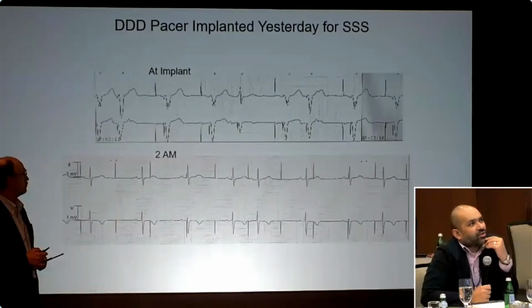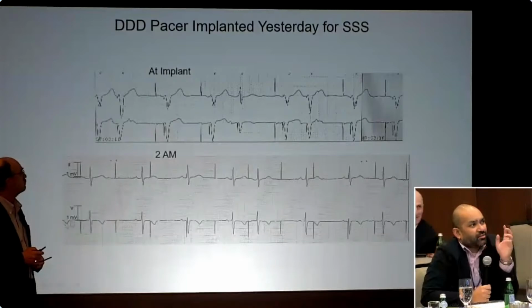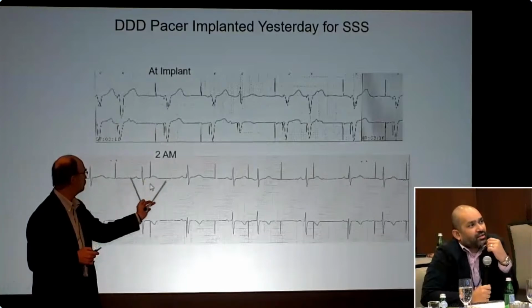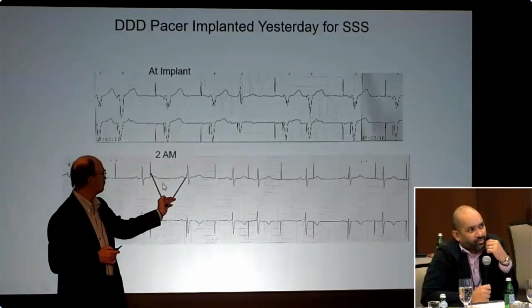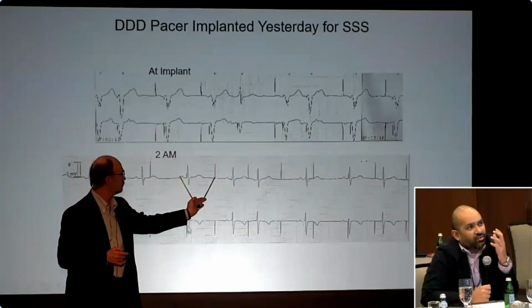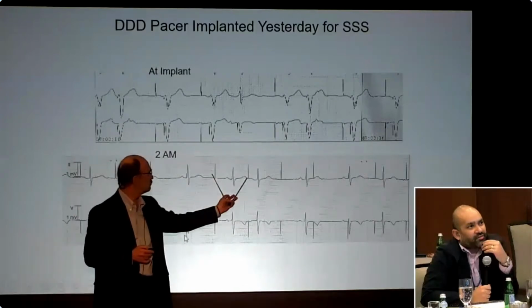Next, what looks like a native P wave followed by a native QRS complex, and I see that on both of the 2 leads. Then again I see a spike that's put in. Then again, P followed by a native QRS. And similarly, as you march down, I see P's followed by native QRSs.